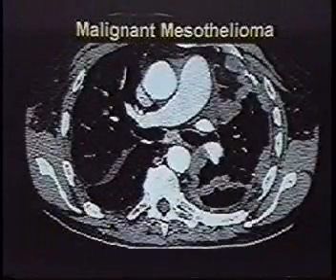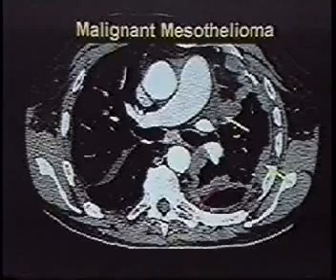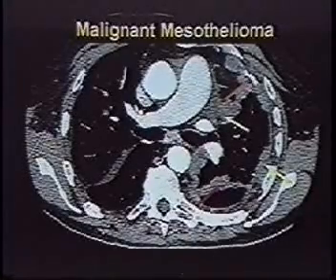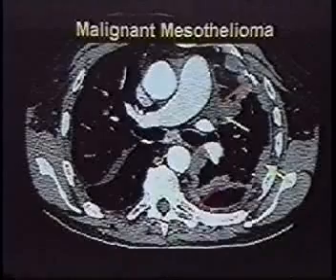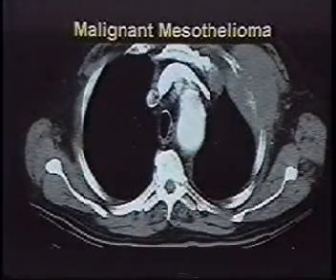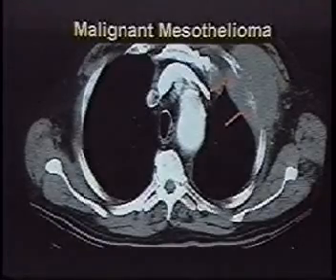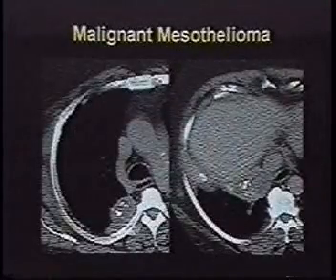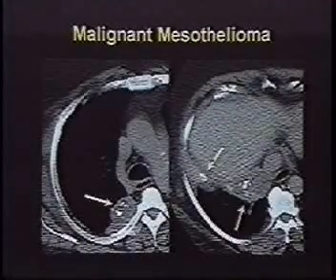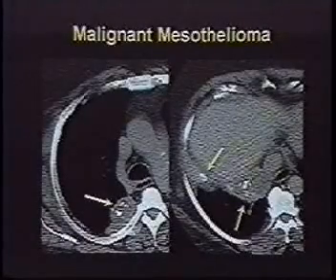Here's an example of malignant mesothelioma with extensive and nodular thickening of the pleura encasing the left lung, with extension into the left major fissure, and a calcified pleural plaque indicating prior asbestos exposure. Different manifestation of malignant mesothelioma, a focal mass invading the chest wall and destroying the rib in its path. And another example with multiple focal masses in the right hemithorax with calcifications arising from an osteosarcomatous component.